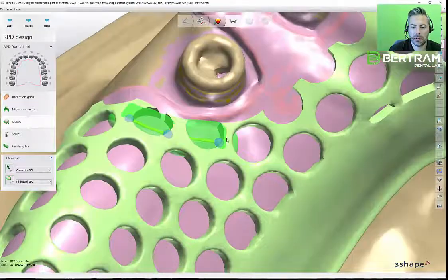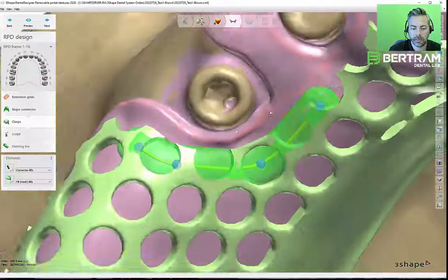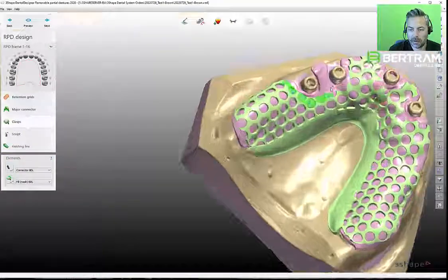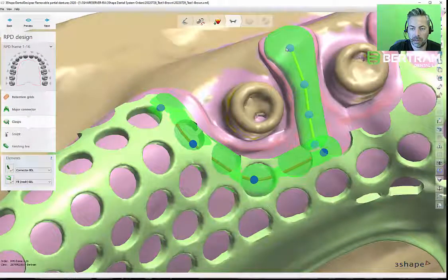So what we're going to do is wrap this nice. Again, this is optional. It just makes it look a little cleaner. And I'm going to show you how now we use this resin gap fill. And I'm using Shift and my scroll wheel here. I'm holding Shift and my scroll wheel on my mouse to go wider. And if I hold Control, you can see with the scroll wheel I can go vertically up and down.